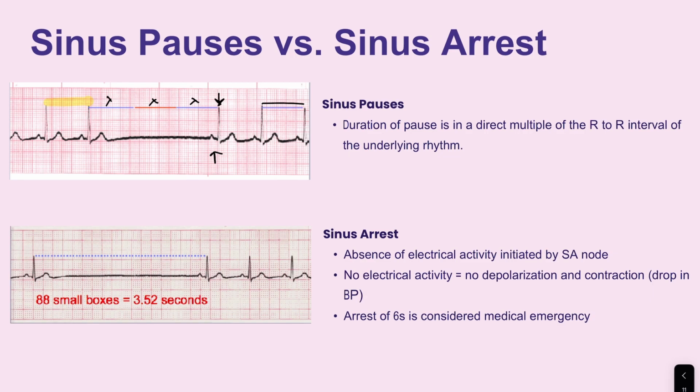Sinus pause. Sinus arrest, this is just the absence of electrical activity. It's initiated by the sinus node. No electrical activity means no depolarization, no contraction, drop in blood pressure, and if you've got an arrest of 6 seconds or longer, it's considered a medical emergency.